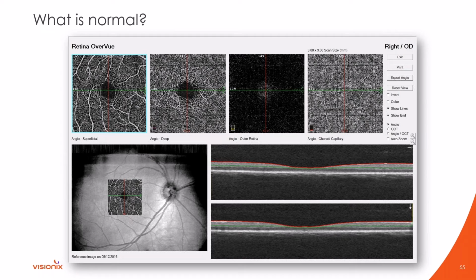At the start of having this technology, it's hard to believe we've had this technology for 6 years now, actually 6+ years. But we didn't have any numbers at the start. I like quantitative data as well, and I bet you guys do in your glaucoma patients. Even when you're looking at the macula, you're looking at the numbers of the macular thickness. So when we started this, 6-7 years ago, we had this fascinating picture, but it's qualitative only. There's no numbers. So on the left here, we're giving slice, slice, slice, slice through the superficial capillary plexus. Notice that capillary network.